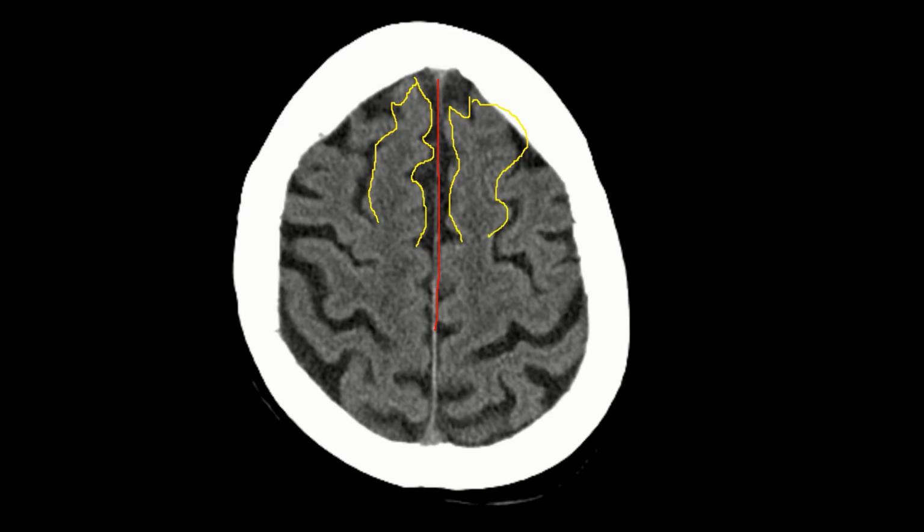So this intersects with this, the precentral gyrus. So let me just shade that. So this is the precentral gyrus. So this is the precentral gyrus on this side. So that forms this nice T. And so this is the, let me switch colors. This is the central sulcus. So let me get rid of all that and draw it once again so you can visualize it better. So this is the T.